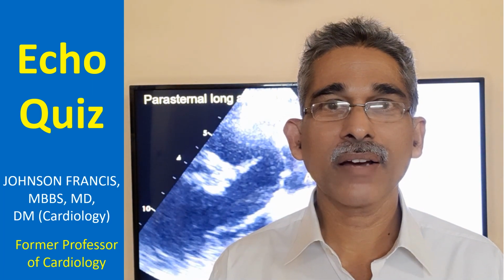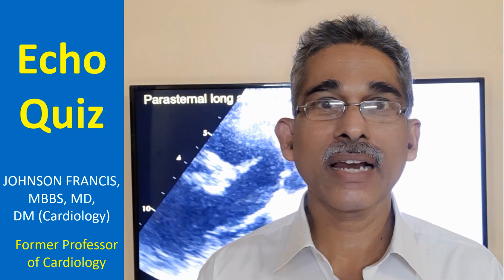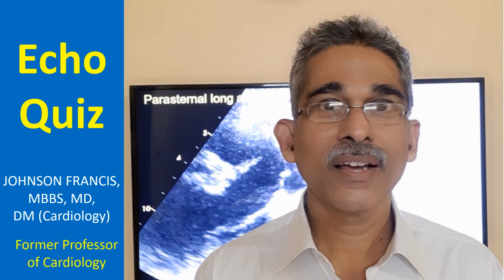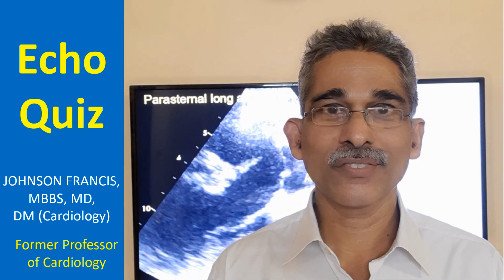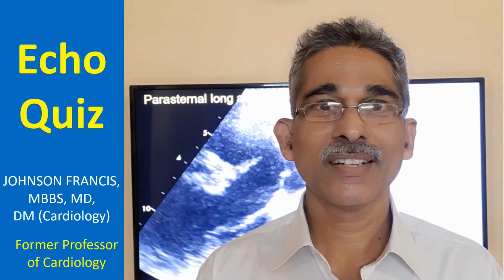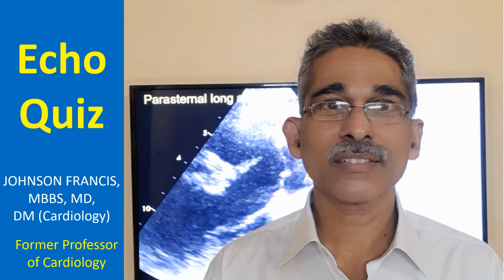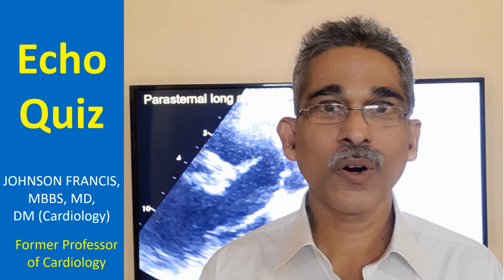Similarly, for echocardiogram, what we would do usually is first a clinical history evaluation, then physical examination, and after that only we proceed with echocardiography in our routine work. But for an academic curiosity, we will just try to interpret an echo image which is a single frame only.